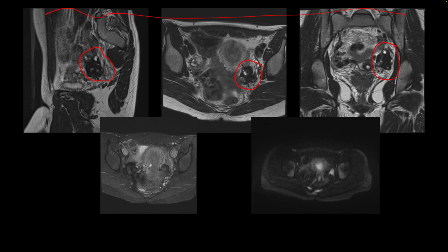And here I'm showing you the uterus, and that the uterus is separate from this enlarged ovary because there are two pathologies that are T2 hypointense. One that is more frequently seen, which is uterine fibroid, and they could be exophytic. They could arise from tissues outside the uterus, such as the round ligament. And the second pathology that is T2 low signal is an ovarian fibroma.